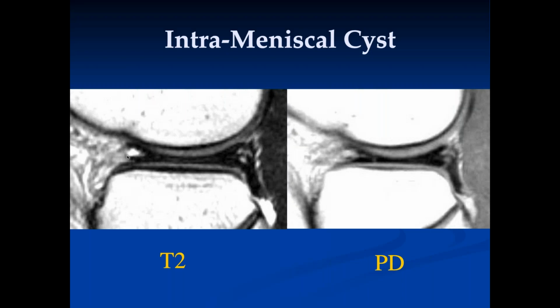We had about 3 intra-meniscal cysts where the fluid was just within the meniscus itself. These are really tears, and occasionally with MR we can't actually see it going all the way to the surface, but usually you can see the tear at the time of arthroscopy. With current quality machines, we can usually see the communication with the joint space.